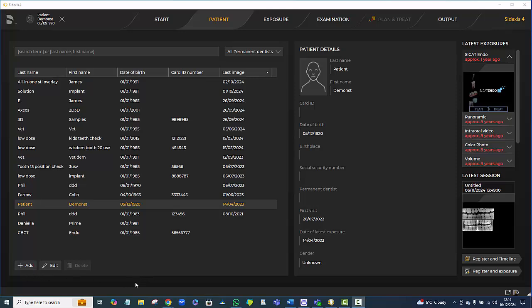If you mix and match the two, you'll get different numbers, which will end up with two patients on the same database. So don't do that. But just to know, if you don't use a link from your practice management software, you add there. If not, use your link. So when you use your bridging link from your practice management software, it will come through to the correct patient.